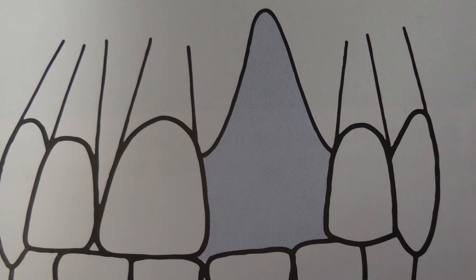Okay, very nice. So what about if the tooth was knocked out completely? Stick it back in as fast as you can. Okay, great tip. So what exactly would that injury look like on a radiograph? Well, you would see an empty tooth socket, basically. Okay. So the dentist might use these images to check for splintered bone or anything else that might have gotten up there in the chance that you didn't get the tooth back in as fast as you could. Obviously clean it first. But okay. Yeah. Awesome. So then you would definitely recommend wearing a mouth guard when playing contact sports then?